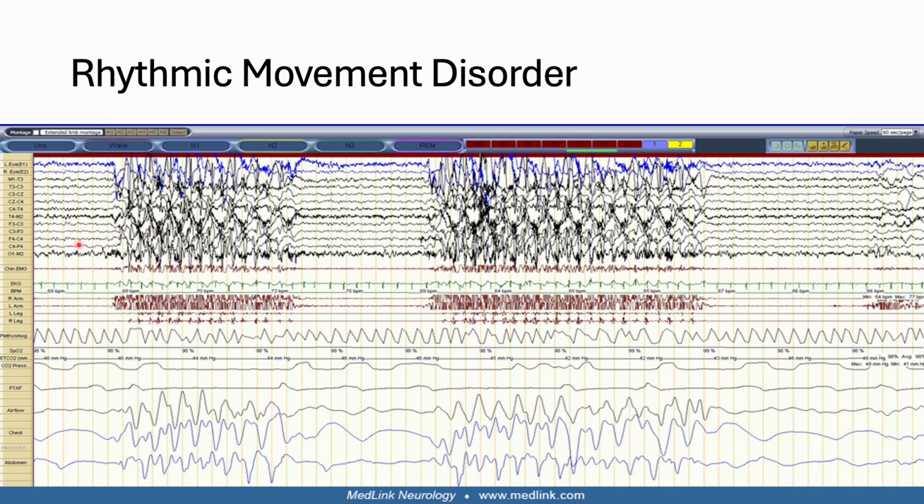It's pretty interesting because it looks like they're asleep here. Then they immediately wake up and immediately start doing that. And then they immediately go back to sleep. And then they immediately wake up again. I mean, that's crazy. When I wake up, I have to figure things out first. You can't fake this kind of stuff, is what I'm saying. You can't fake going to sleep and then you immediately wake up and start doing something. So this is, I think, a very fascinating thing.